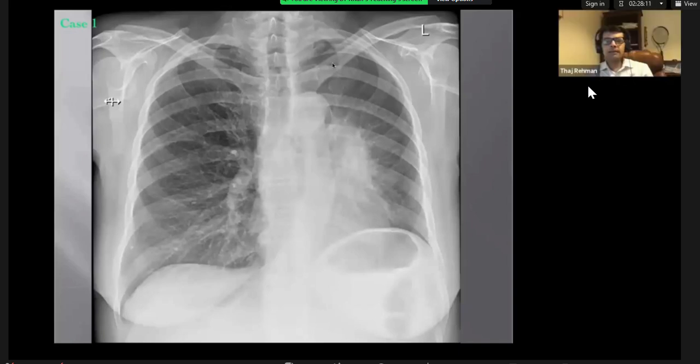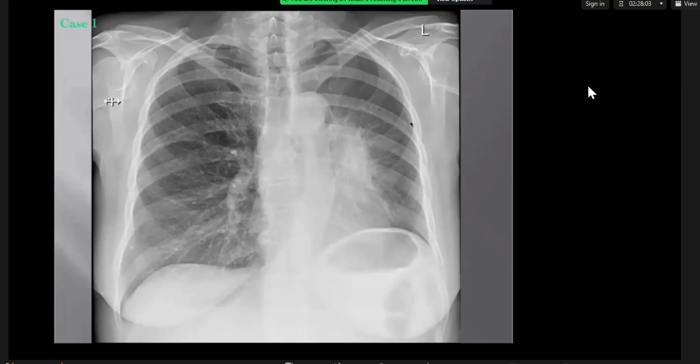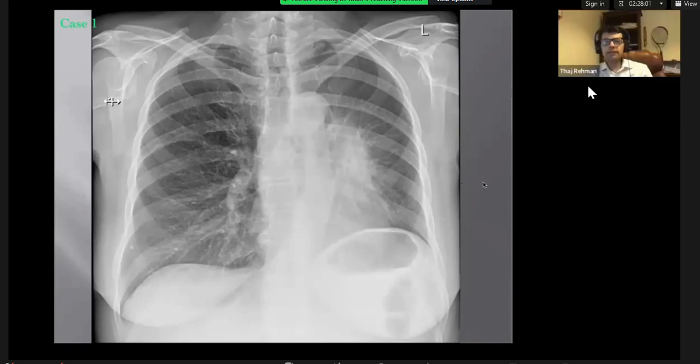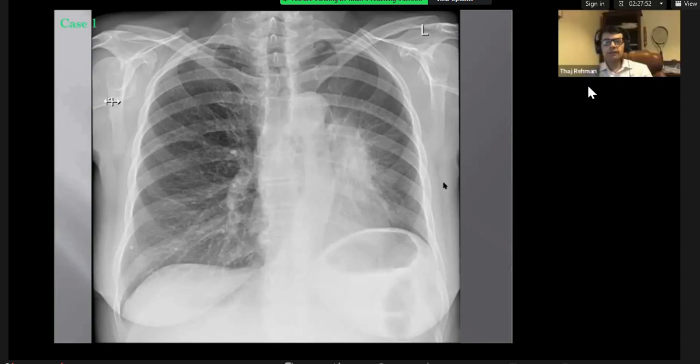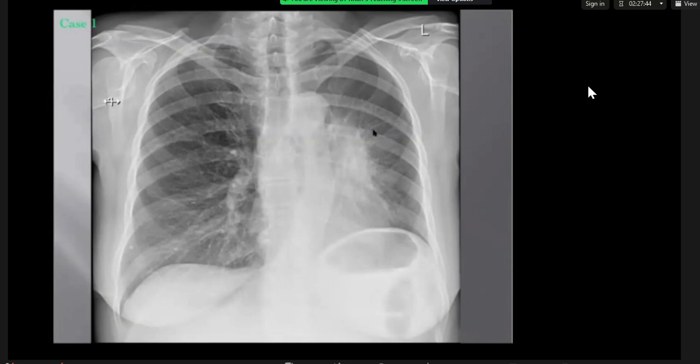And what's happened is that, did you notice that the left lung is smaller? Not initially, but I can see that now. And what about the blood vessels in both lungs? They appear more prominent on the right. So is it the other way around? They appear sparse on the left side. So what is happening here?